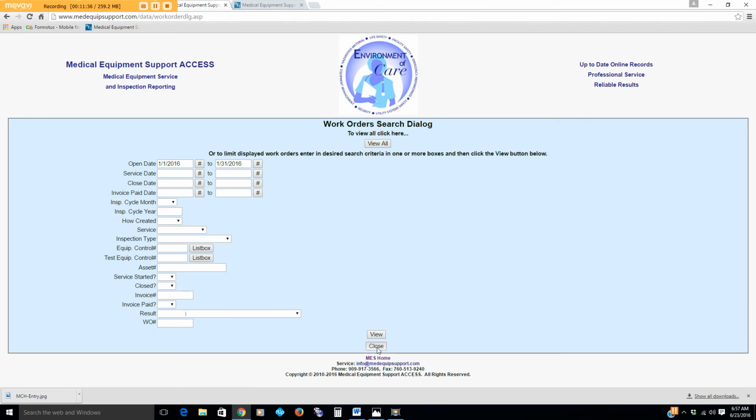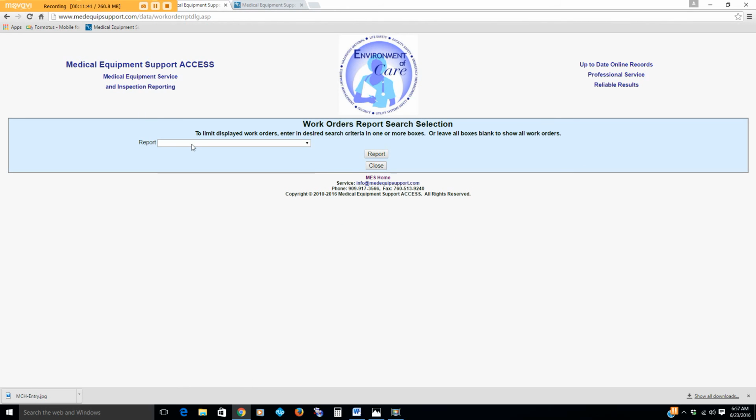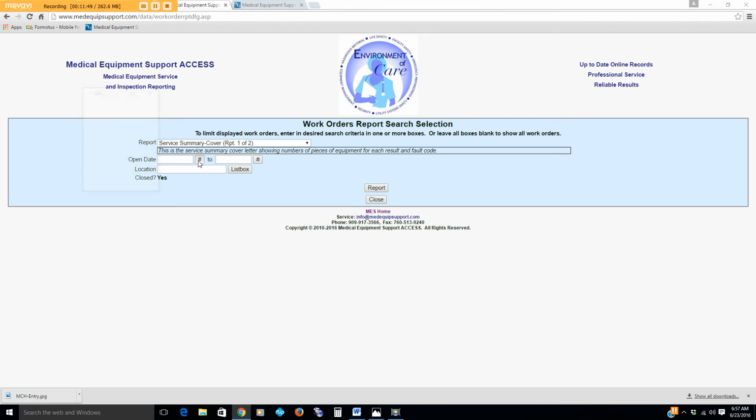Back to the secondary dialog screen. And now we're going to go into reports. We have several reports here. You have service summary reports. We'll click on service summary reports. This is something that we can use for environment of care meetings. I'm going to put in January, and pick January.